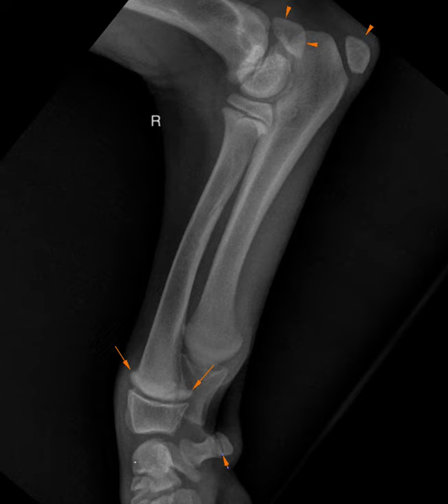From here, it's reasonable to wait on pursuing any orthopedic-specific angle for this case because we haven't found any major orthopedic issues on the radiographs. This could be very, very early panosteitis. I'm not sure about early hypertrophic osteodystrophy. So certainly as the puppy ages, if the pain continues and it's localizable orthopedically, repeat radiographs could be a reasonable step. But for today, I think we have nice bilateral evidence of symmetry at the physis, and I would think that this is most likely normal for this puppy.